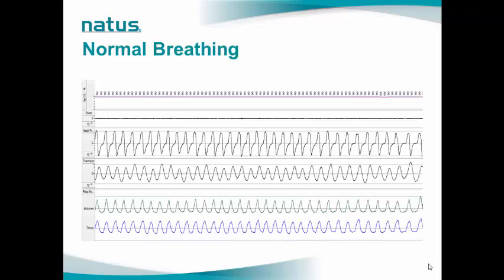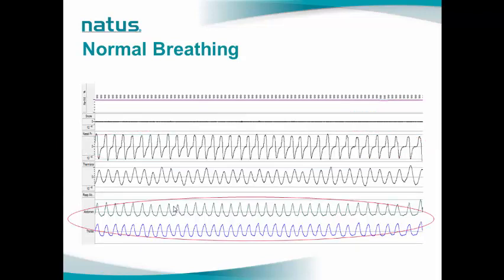First, it's important to be familiar with the normal breathing pattern in polysomnography. This is a 2 minute window. We have SpO2 on the top, we have snore, nasal pressure, thermistor, and the respiratory effort. This is a sinusoidal breathing pattern, no distortions, no flattening of the inspiratory portions that are located upward. Furthermore, if you look at the thoracoabdominal effort, you can see the synchronicity of the pattern. These findings support a normal breathing pattern.